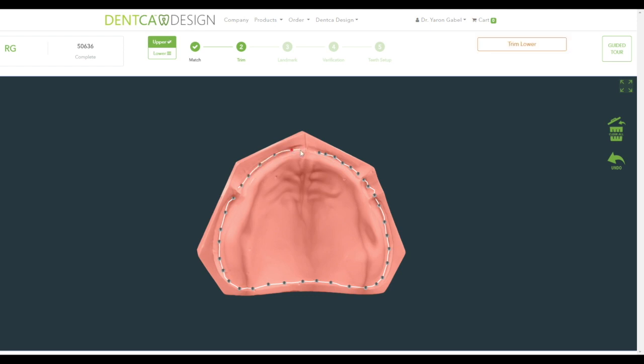While adding waypoints, if you see that the connection line has become too long, please delete the point and reselect it closer to the previous one. The trim line must be connected in a circular pattern. You can add waypoints by clicking on the white connection lines. Modify any points in the line by double-clicking them until the dot becomes red and then dragging them to change position or clicking on the Delete button to eliminate them.